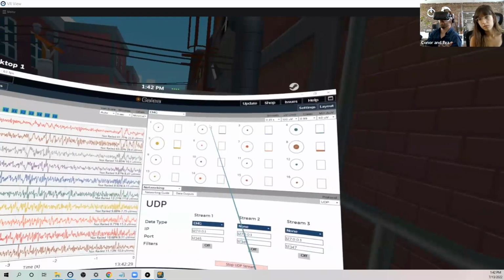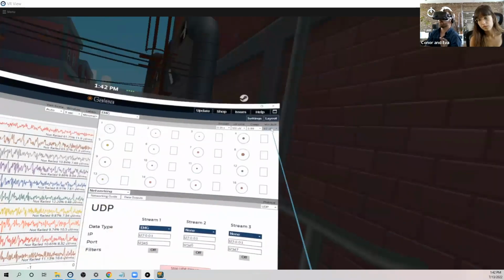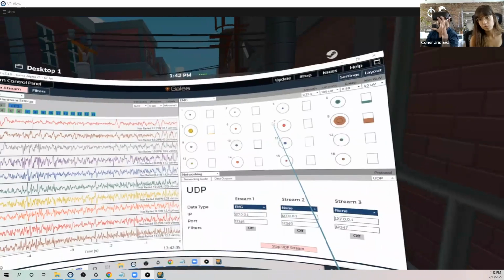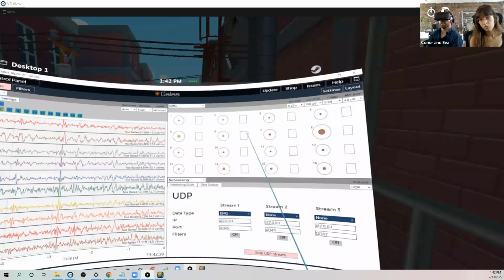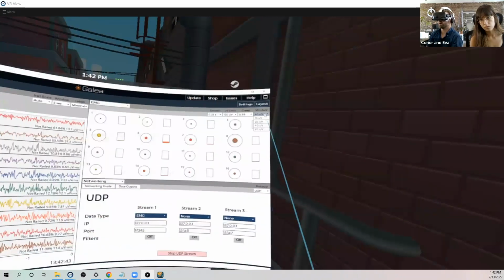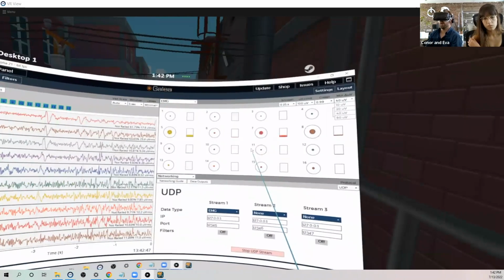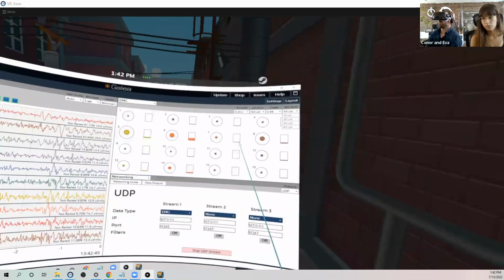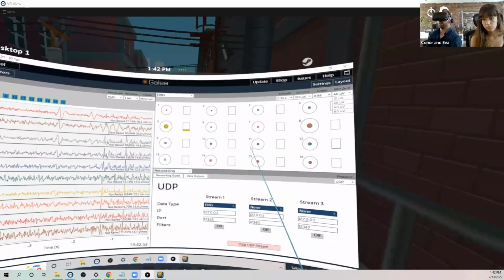That's the minimum range. What that does is allow you to prescribe what your expected flex strength is. If you're flexing really easily and hard and you're generating a lot of microvolts with each flex, you may want to increase this value so as to not trip the switch too easily. But if you're having a hard time tripping the switch, you may want to decrease this value to allow your threshold to be triggered more easily.